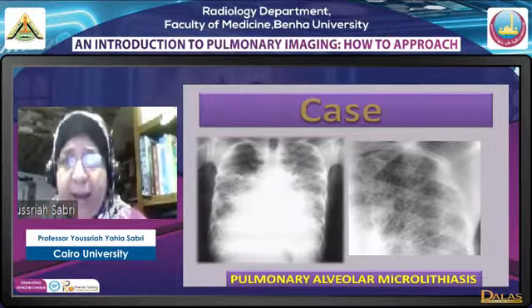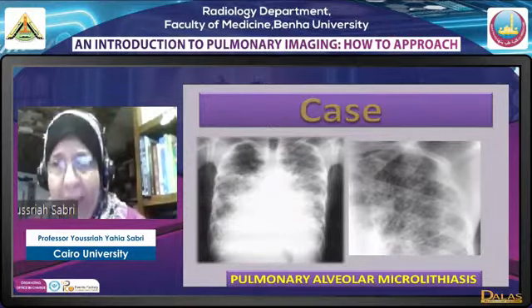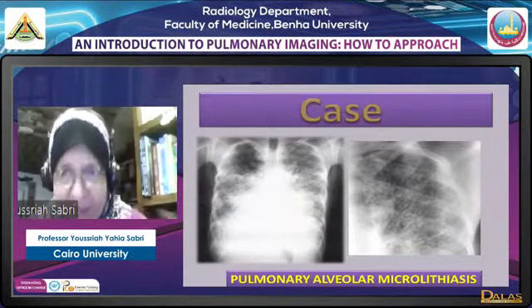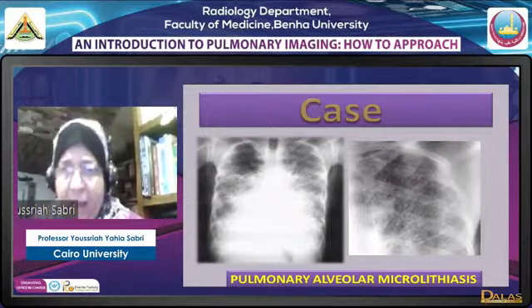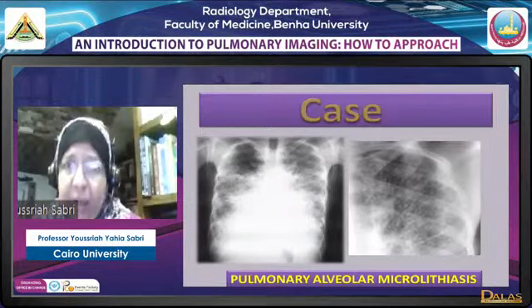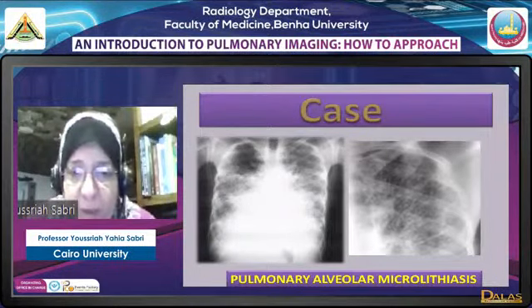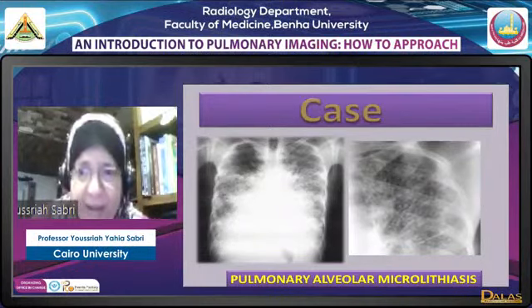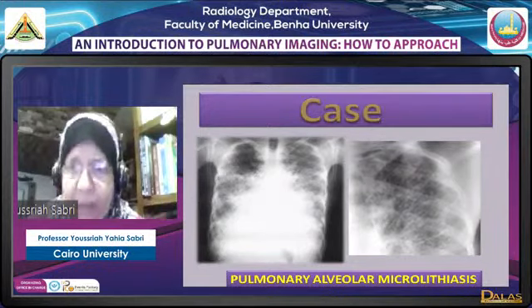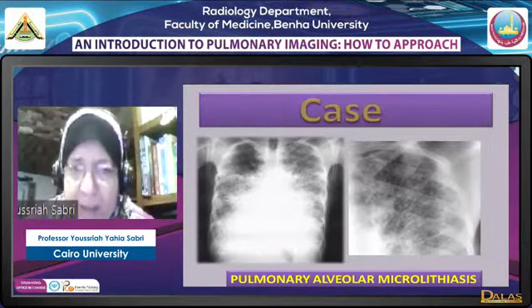Okay, and this is called the sandstorm appearance. You don't diagnose microlithiasis just by seeing what you think are dense nodules. It might be a fallacy, a technical fallacy of the film. You have to see ill definition of the heart, ill definition of the diaphragm, and hyperinflated lungs. The lungs are hyperinflated. They are actually increased in volume. Okay, so this is pulmonary alveolar microlithiasis. It is a rare entity, and most of the time it's of unknown cause. Some people suggested a few years ago that it may be some sort of familial, but it hasn't been proved.